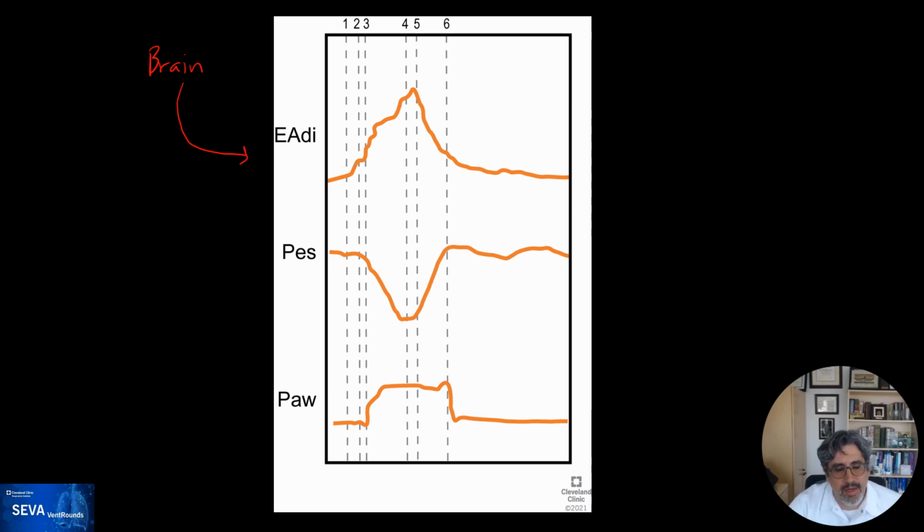This is a curve that has been smoothed out from all the signal that comes from the electromyogram, and it gives you this signal where you can see the start and then essentially the end of the breath. In NAVA, it starts 70%, it ends 70% after the peak. But just to put in images for you where the breath starts and ends. After the electrical activity of the diaphragm is occurring, you would see contraction of the muscle, and that should happen relatively fast afterwards. And this would be manifested.